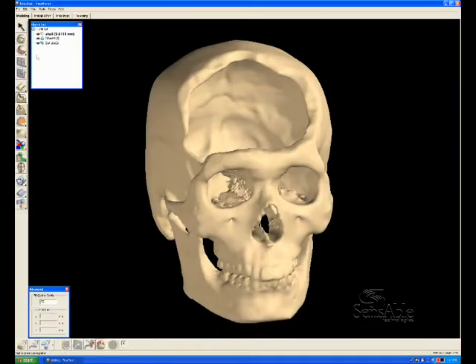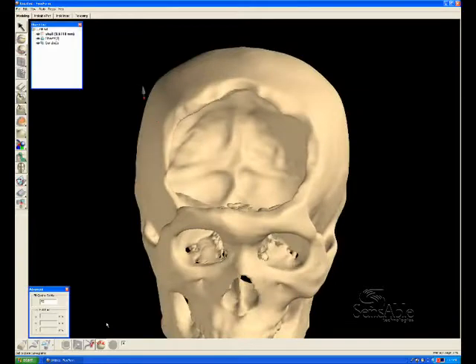In the following demonstration, Freeform Modeling Plus will be used to model a custom skull patch implant. CT data of a patient's skull was converted into an STL file. That STL file can be imported into Freeform Modeling Plus and converted into virtual clay. Once virtual clay, the model, in this case the scanned skull, can be felt with the Phantom desktop device.